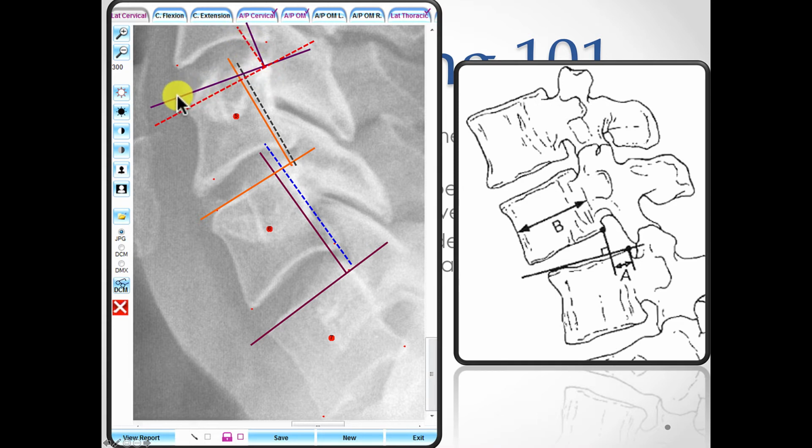So what I recommend you do is you always digitize to accommodate the disc plane line, right? That is what really makes sense. Because the vertebrae are stacking on the disc, not the disc level, the vertebra above, unless it was a complete compression deformity on a complete angle, then that's the time that it would make sense to measure that end plate.